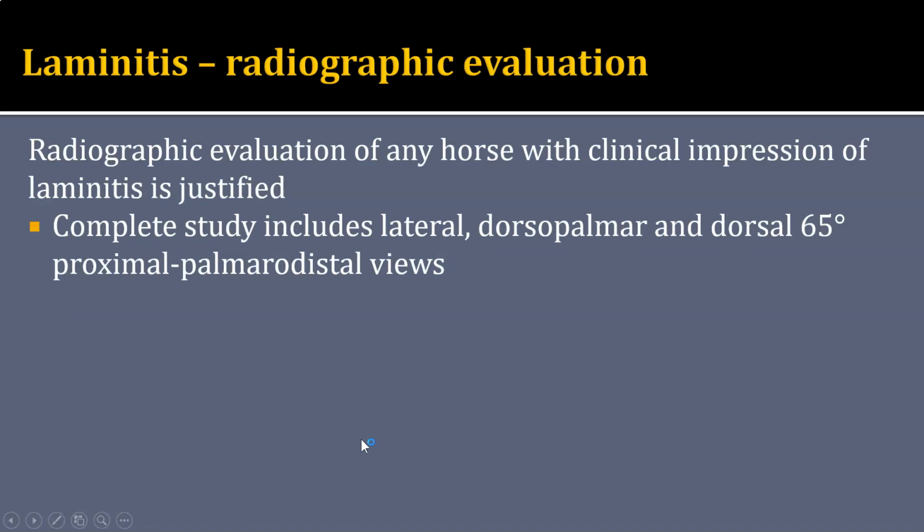Radiographic evaluation of any horse with clinical impression of laminitis is justified, and your complete study should include lateral, dorsal palmar, and the dorsal 65 proximal palmaro-distal views. I will say clinically, a lot of times only the lateral views are obtained, but for complete evaluation, I think it's important to obtain all of these views.